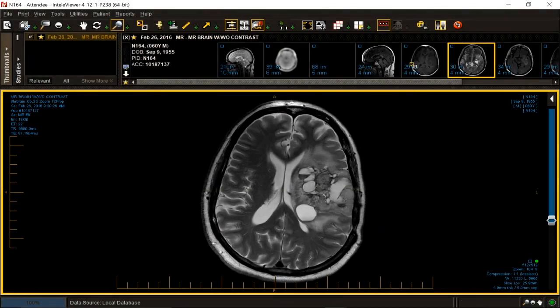Oligodendroglioma likes the frontotemporal centrum semiovale, and finally, every area that's abnormal on FLAIR in a true oligo is abnormal. Same patient. The original study was on 4/4/12. The new study, 2/26/16.